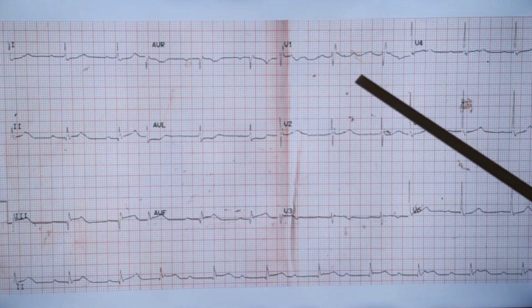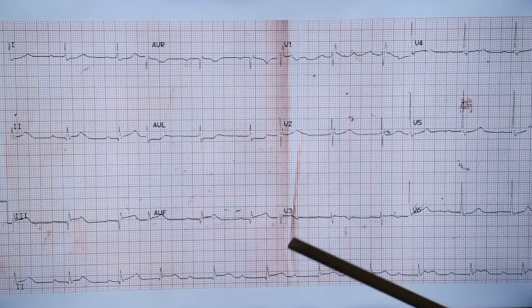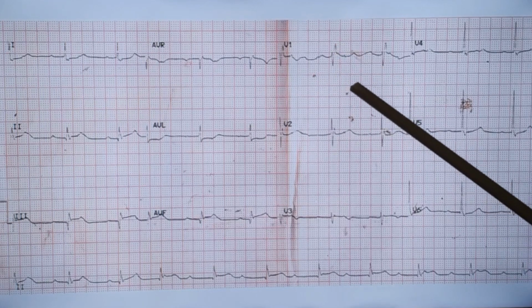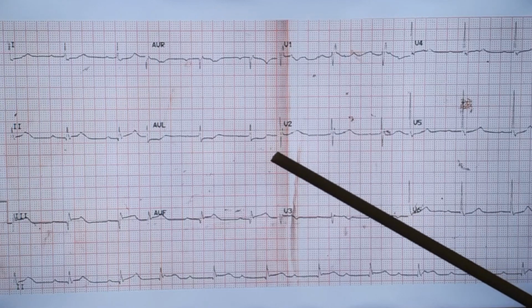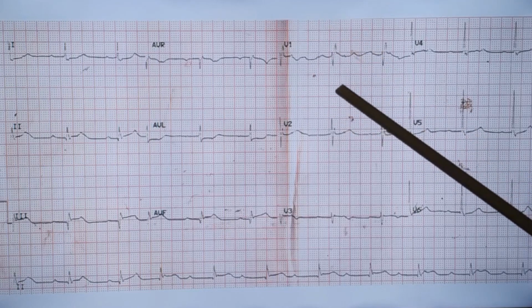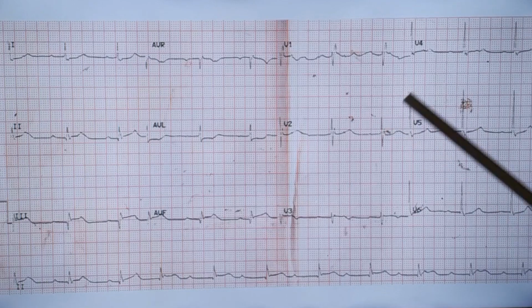This is an odd finding, which you could explain by associated disease of the LAD, left anterior descending coronary artery, or the other possibility is right bundle branch block can occur in normal individuals also. Some normal individuals do have right bundle branch block without much structural heart disease. So if this was pre-existing, now when an inferior wall infarction occurs, we will see all these findings together.